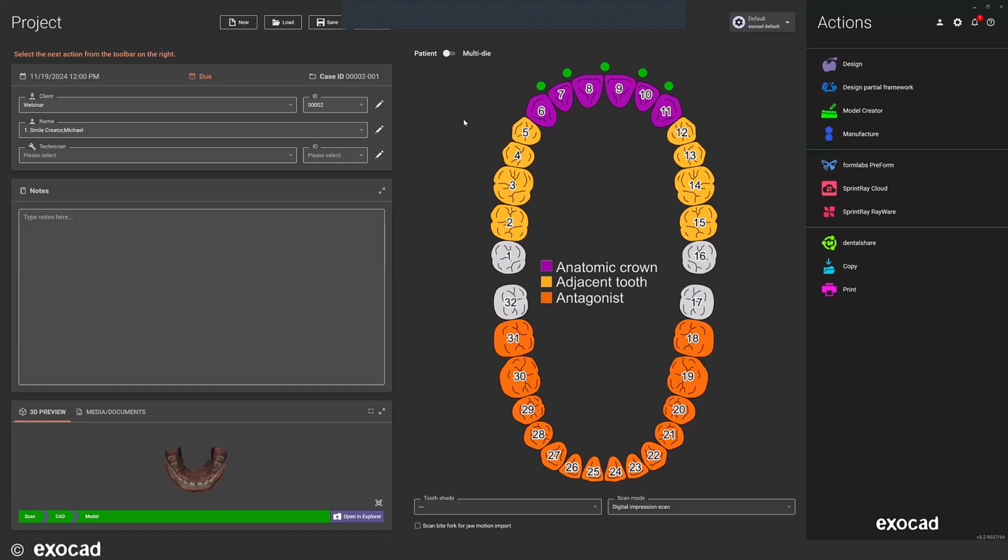How do you create models for injection molding? That's really the end process of the model design process that Dan went through. When you create that model with the design incorporated into it, you can print that and create a suck down over it, and then you'll have that hollow space incorporated in the mold that you make over the model.